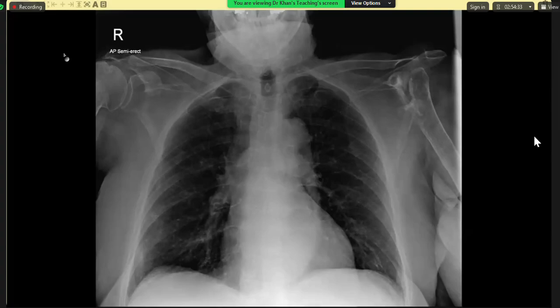There is abnormality seen in the left humeral head with some absence of the humeral head contour and quite severe abnormality seen on the glenoid part as well. There is superior subluxation of the whole of the humerus with an abnormal pseudoarthrosis type of appearance.